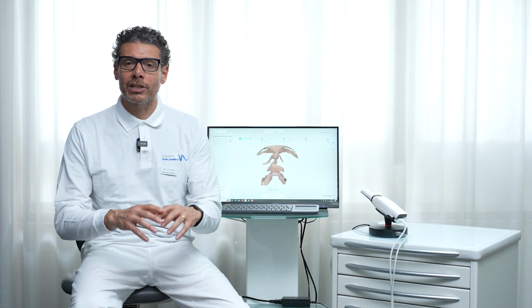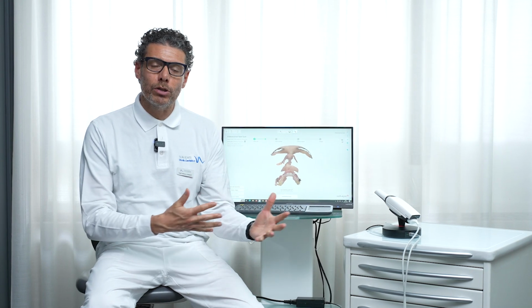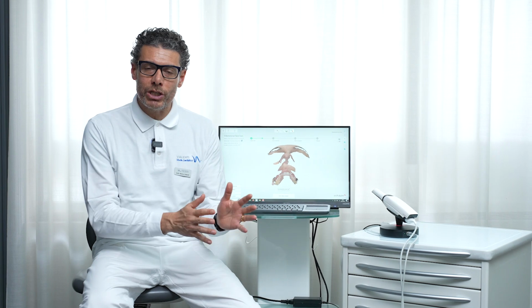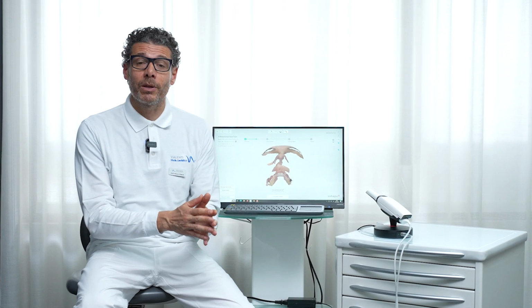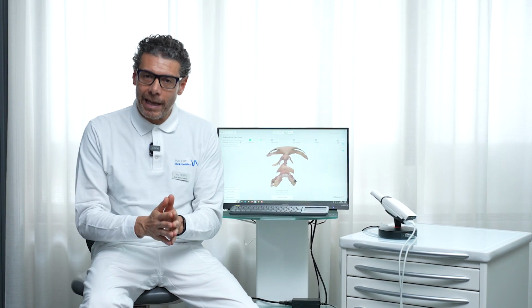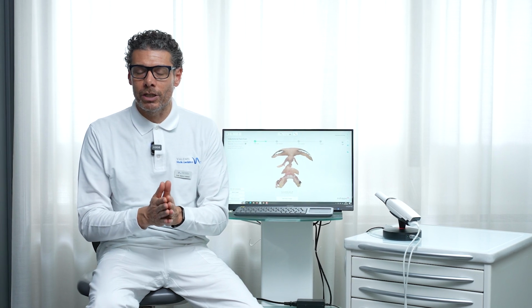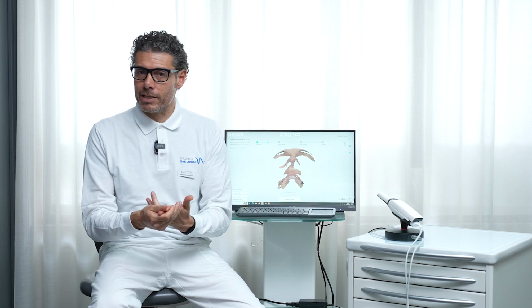We are working in a 3Shape environment with all the files we center, using two types of scans. The first type is much more immediate and easier because everything is done automatically. The second type requires the technician to work a bit more by utilizing 3 scans: the intraoral scan, the perioral scan, and the facial scan with the lip cutout.